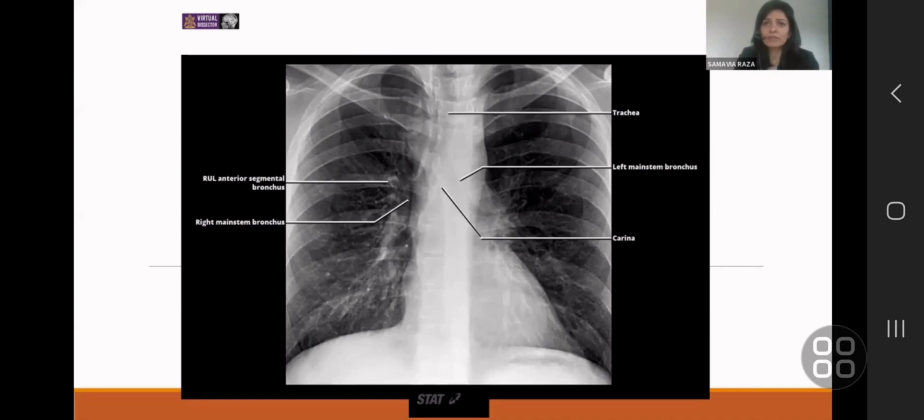The only reason in a viva you will be asked, do you know what is the normal dimension of the trachea, is when you have put the examiner down that route, when you have called it abnormal when it wasn't abnormal, or when you haven't picked that it was abnormal. With time and experience that comes itself, and most of the time the orientation or the shape of the trachea is more important than the size.